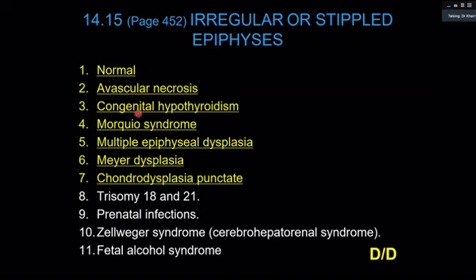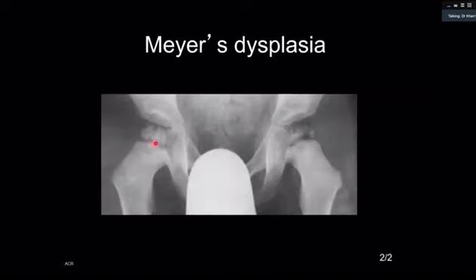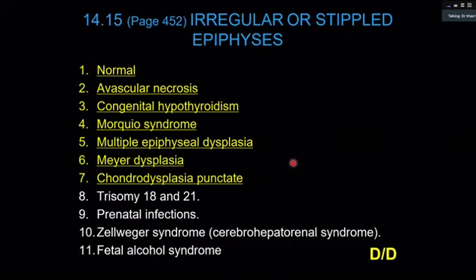So the case there was actually Meyer's, because the other epiphyses were absolutely normal, but nobody is expecting you to just say Meyer's on this. But for discussion, you have to know this differential. I use the word discussion cases. They are coming in FRCR more commonly these days.